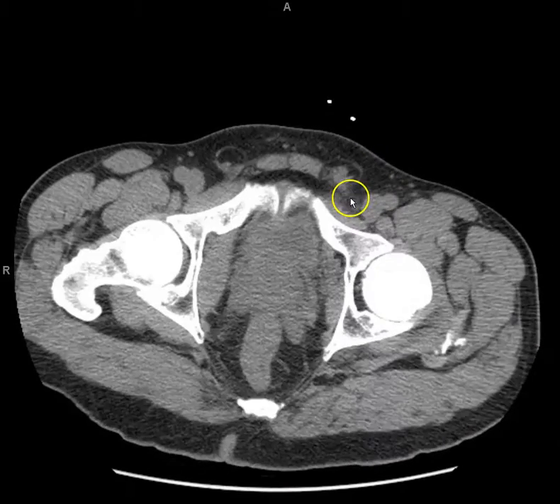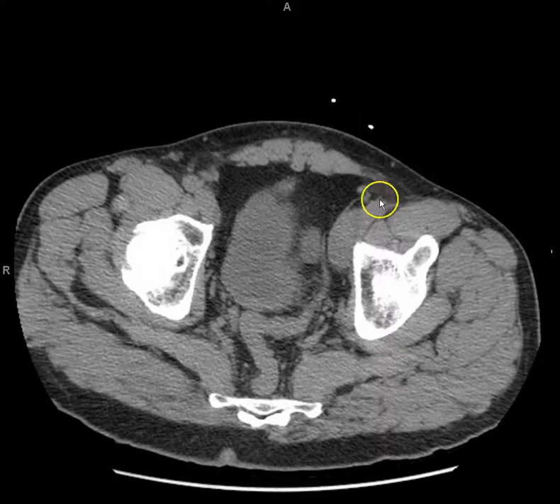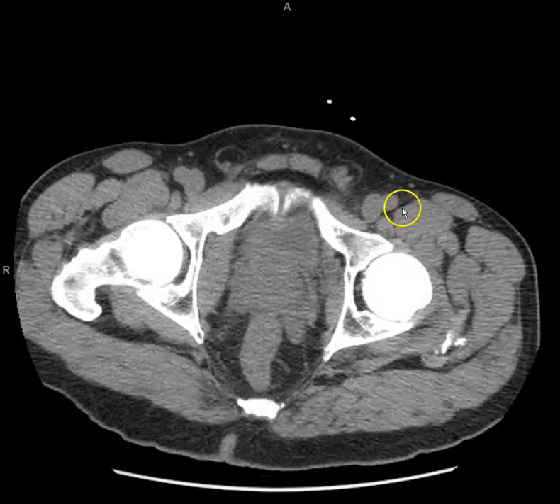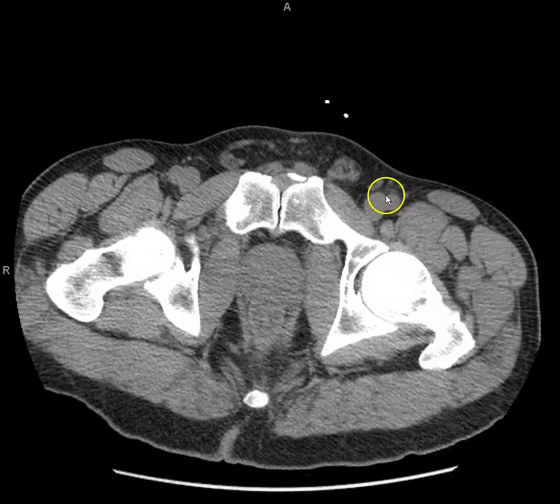Now, if you go further, you can see the vessels here then cross through this, right? And then maybe change names. So what is this called now?